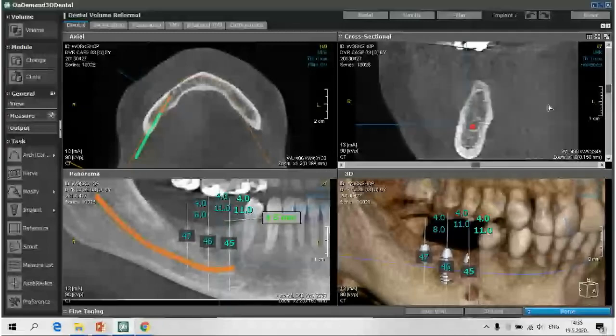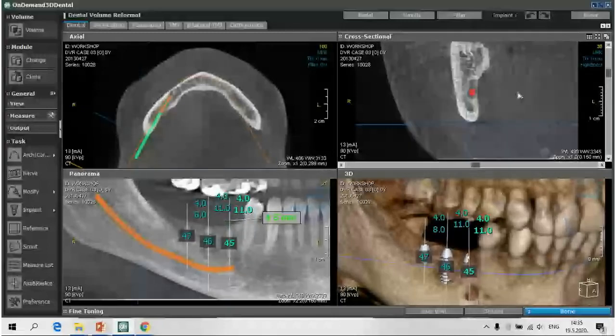When we have finished this, then we could check if we are inside of a structure we could recognize as a nerve ending here. And here is a double canal, but because it is not in a region where we need to perform any kind of action, in this instance this is not important.